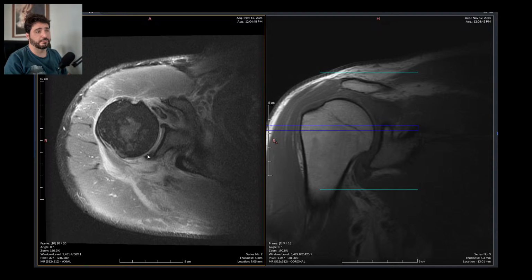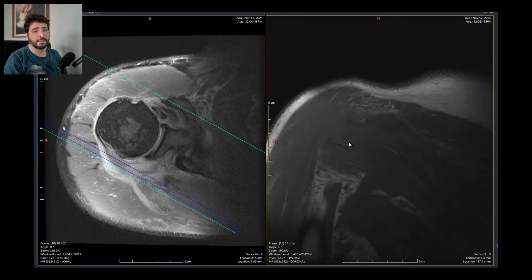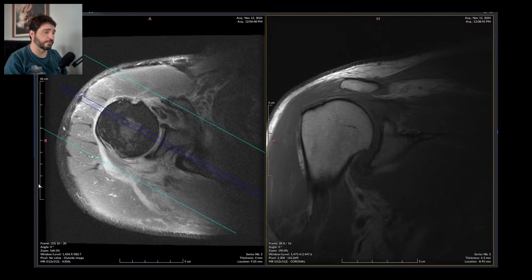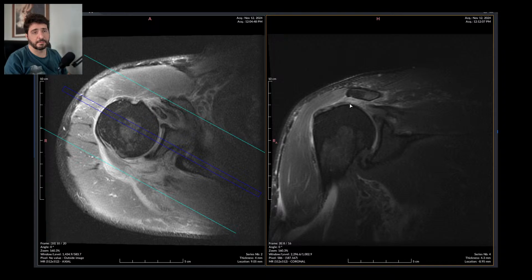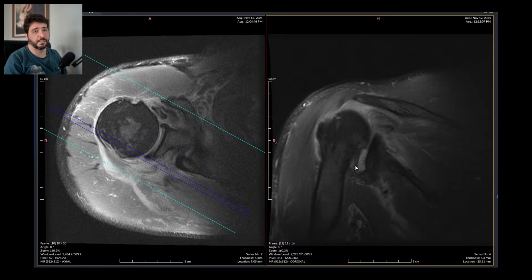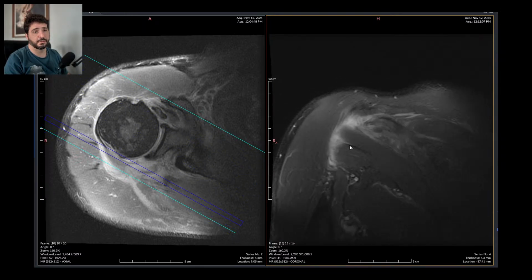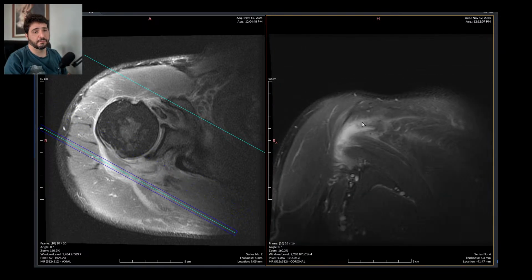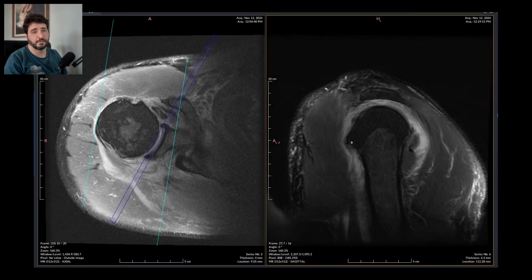There is clear arthrosis of the glenohumeral joint. There is probably rupture of every other tendon of the shoulder. Yes, there is rupture of the supraspinatus right there. Infraspinatus. Yes, the infraspinatus is also ruptured. The teres minor is there. Let me see if they have a sagittal.